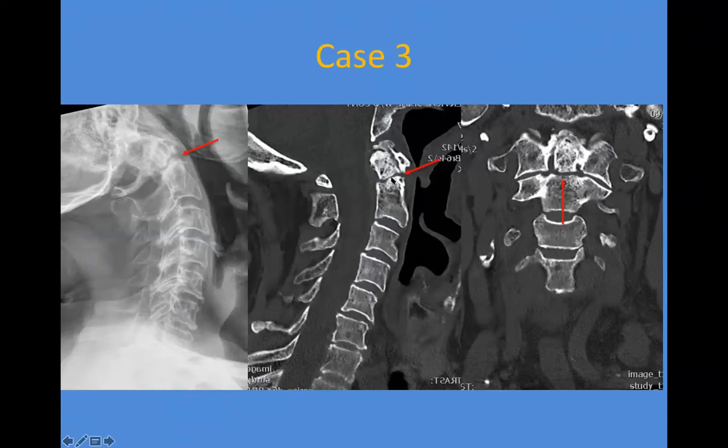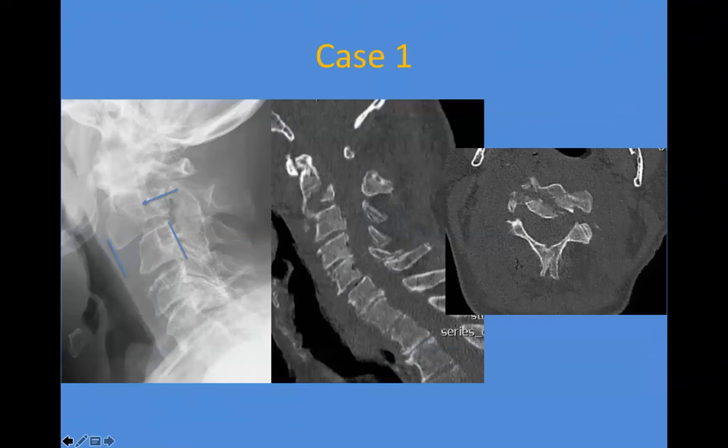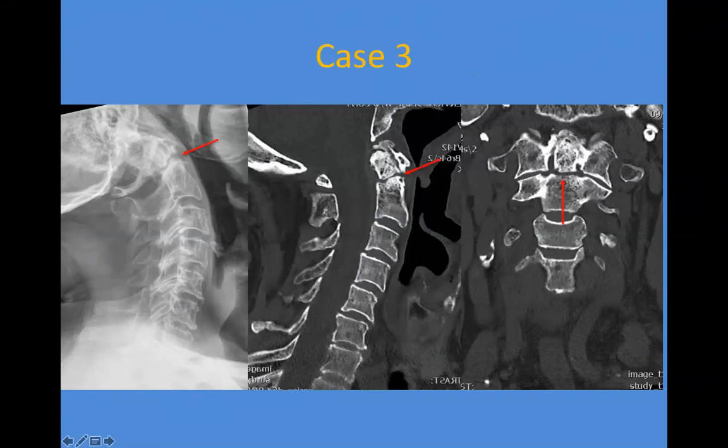Because a normal fracture, when we go back, let's just compare that. Look at this fracture line here. Look at this fracture line here. Look at this fracture line here. It doesn't have any white margin here and here, right? This stuff is the cortex, but along the margin of my fracture fragment, I shouldn't see that kind of sclerosis that I'm seeing here. So this tells me that this is an old fracture that didn't heal. And the sclerosis and subchondral cyst formation is here because these two fracture fragments have been rubbing against each other chronically.